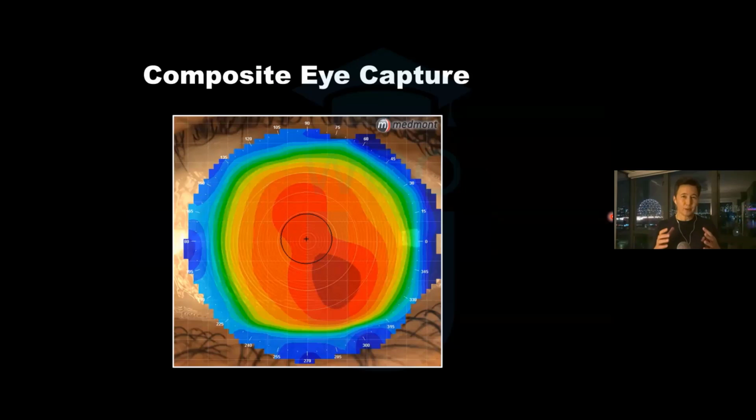From the experts at WAVE, they tell us that we need to explore this capture with the WAVE software a little bit more. The WAVE software wasn't built specifically for a composite type capture. So there may be some things we need to learn before we can really use this with great frequency. Personally, I feel very strongly about this capture.